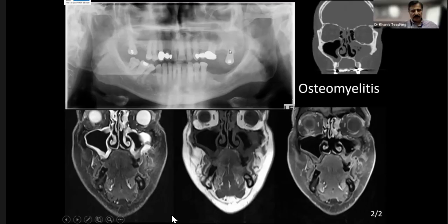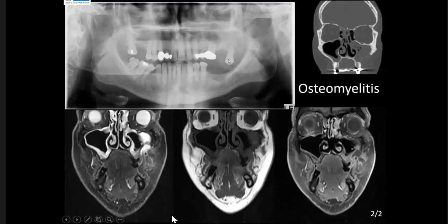So here the learning point, the exam point, is that look at this tooth here and look at this tooth. Now from here to here is the crown and this is all eaten up. There is no crown, and this is the root. And there is a bit of lucency even here, what we call a radicular cyst. So there is infection of dental origin.